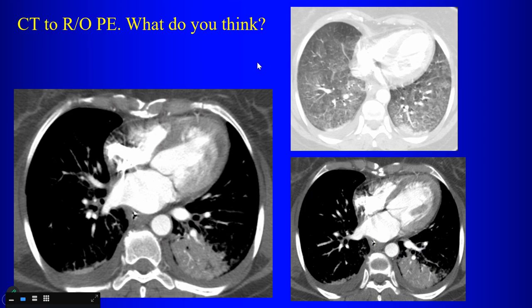You're thinking what? Pulmonary edema. We're thinking pulmonary edema. And we talked about the categories. The two broad categories of pulmonary edema. Cardiogenic or non-cardiogenic. Do we think this is cardiogenic or non-cardiogenic?